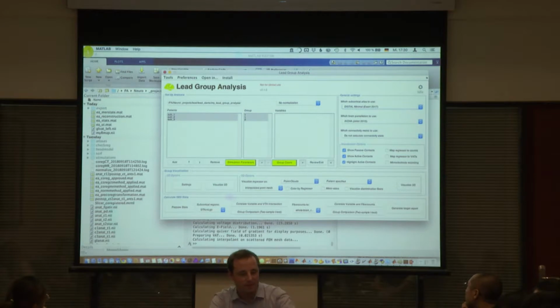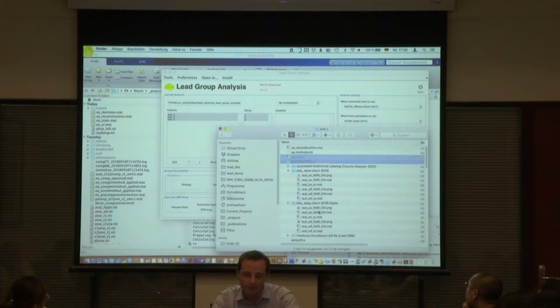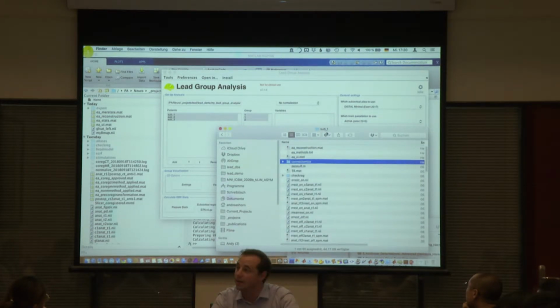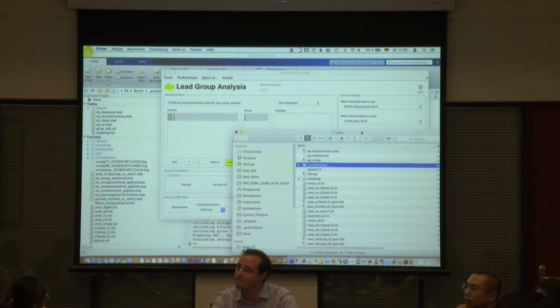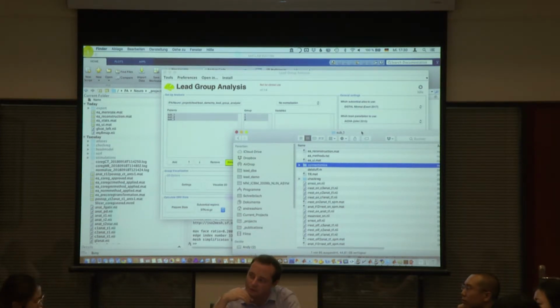So maybe to show you in parallel an important thing, we are now currently creating VTAs. And I opened the first. So, if you were to modify the script, the script subroutine that is currently being used, where is it accessible to modify it? Sorry? It's not really about modifying. I think you would rather really have to create your own scripts.